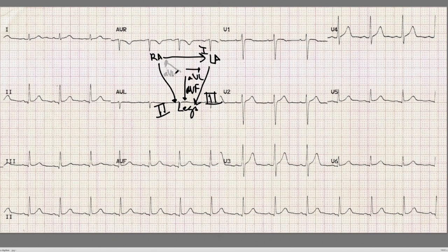So essentially, if the direction of the wave is in concordance with normal, which is from the atria to the ventricles in the way the heart is sort of shaped like that, then it's in concordance with lead 2. As you can see, it goes in the same direction downwards and towards the left, and it's also in concordance with lead 1, and hence that's also positive. That's why in this normal ECG you can see the QRS complex is positive in lead 1, positive in lead 2, and because it's also in concordance with AVF, you can see it's positive in lead AVF as well.